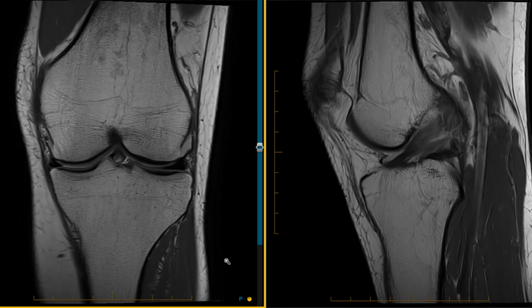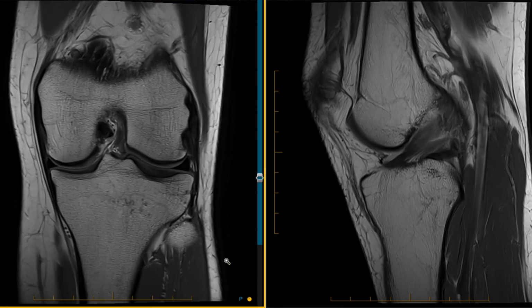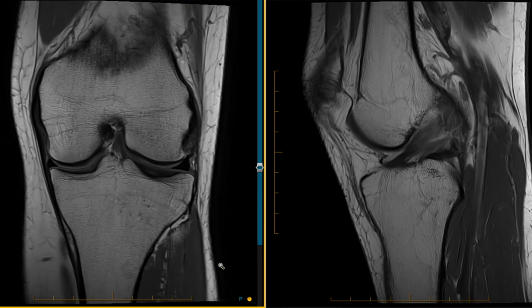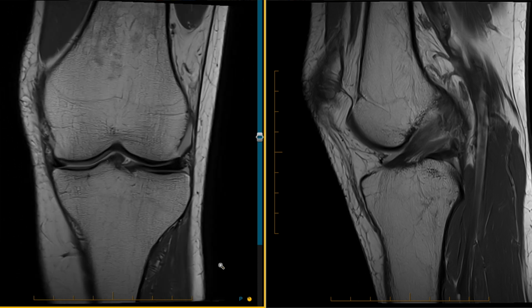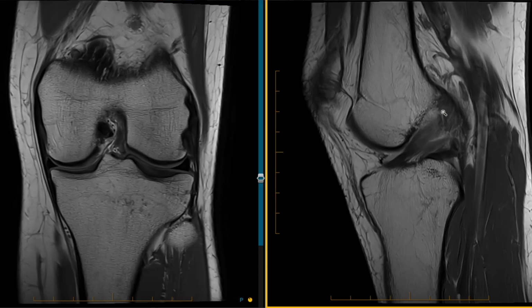This is going to be a quick video on assessing displacement of ACL tissue in cases of ACL rupture for the purposes of the classification system. So here is the first case, which is that of a non-displaced ACL rupture. So you can see on these sagittal images there is an upper segment ACL rupture with minimal gap between the two ends of the ACL.